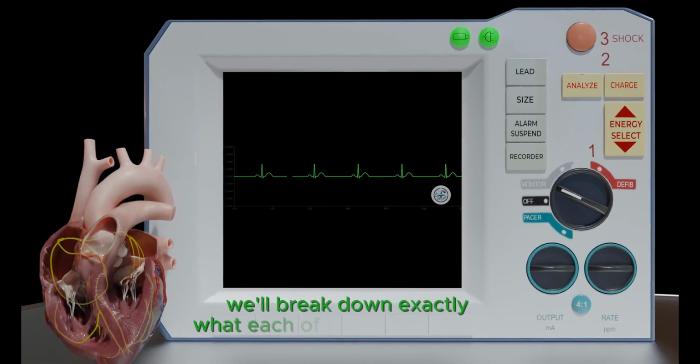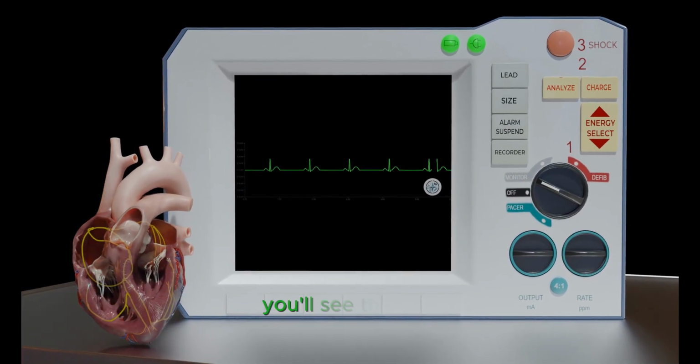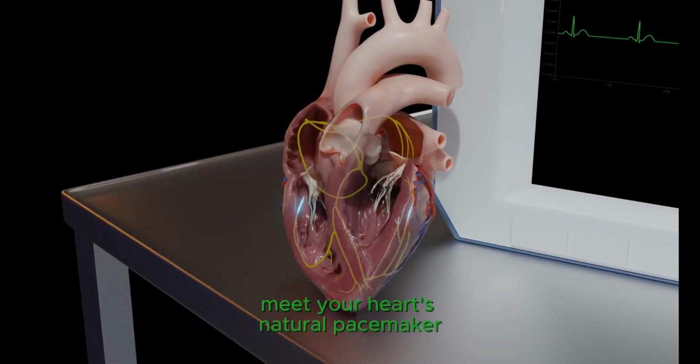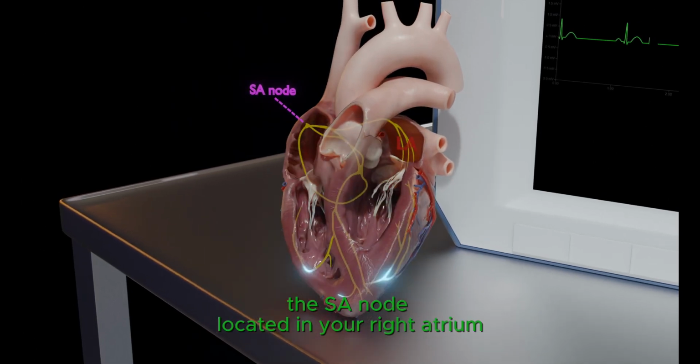In this video, we'll break down exactly what each of these waves mean, step by step. By the end, you'll see the EKG in a whole new way. Let's dive in. Meet your heart's natural pacemaker, the SA node, located in your right atrium.